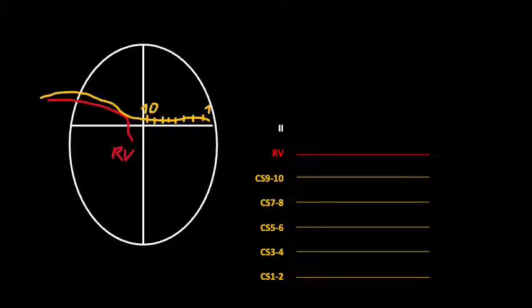Hello. Today I would like to present one of the most important maneuvers which can help to determine presence of accessory pathway, especially the accessory pathway located in the area of bundle of His. In previous video I described the role of incremental and in general of ventricular pacing, during which we can easily prove the presence of left-sided accessory pathway.